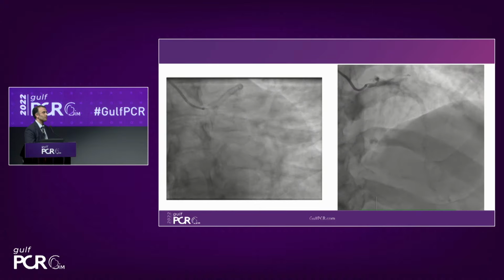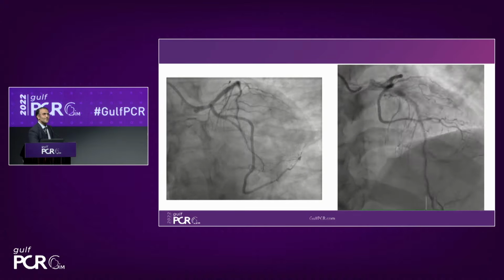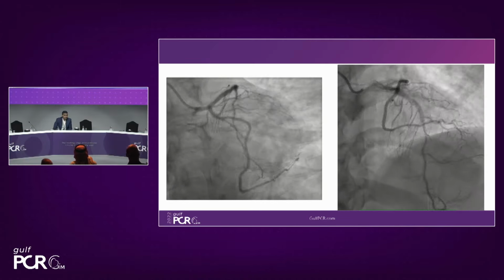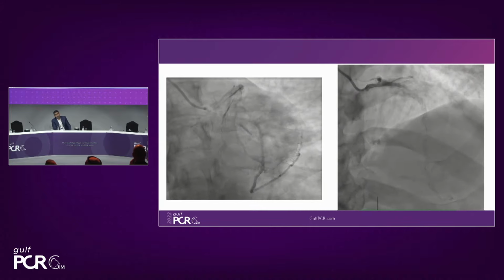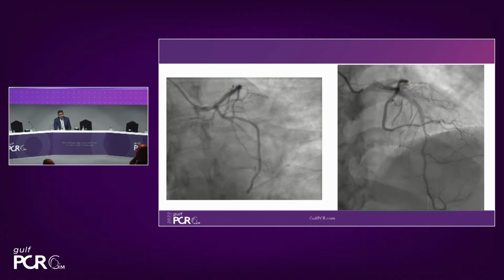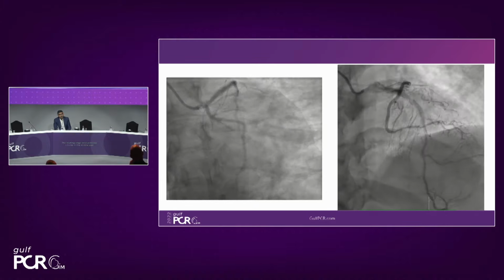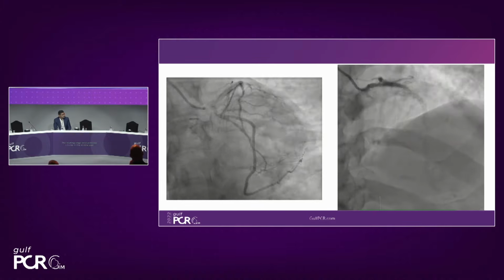Please. Hi, I've got a small question for the panel. It's a great case, beautiful case. Can you hear us now? Yeah, good. If we find this nodule, and if you were to go back in time and do this again, and you decide to rotablate, can you show us how you would measure the size of the burr that you should use, based on the images that you've got?